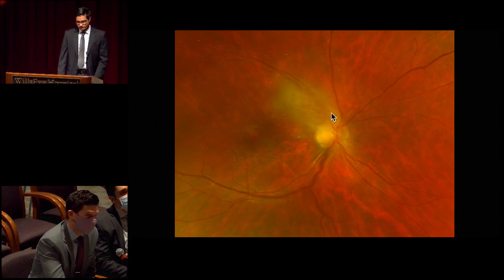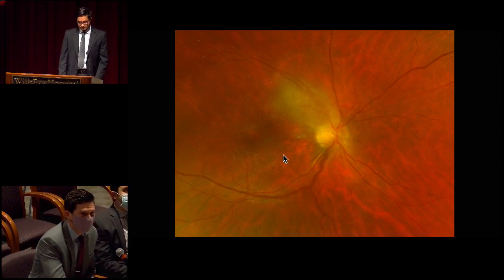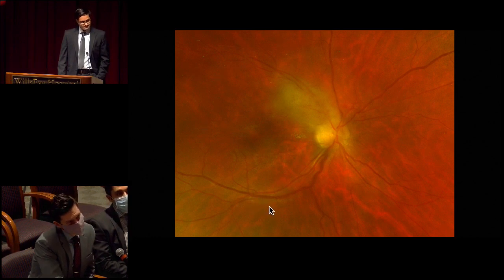It almost looks reminiscent of a large cotton wool spot, but again, the central macula itself looks relatively spared, though maybe there's a little bit of loss of some foveal definition here, and maybe a little bit of some mild vascular tortuosity in the area around this lesion here. So there's hard exudates here, but looks like they're tracking all the way down to here, doesn't it? Yeah.